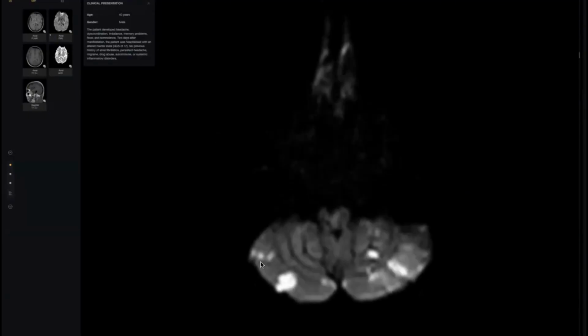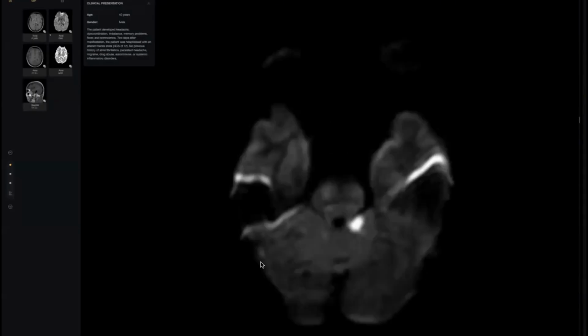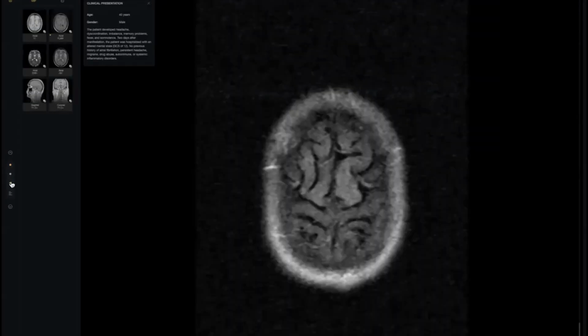When you see multiple scattered strokes like this, think of vasculitis. But the point here, what is this? Is this inferior sagittal sinus thrombosis? Is this basilar artery occlusion, or is this artery of Percheron occlusion? All the possibilities are still suspected. So he asked for the angio.